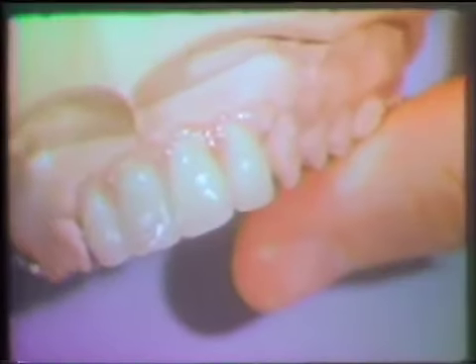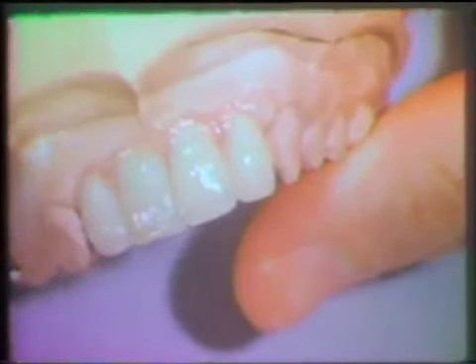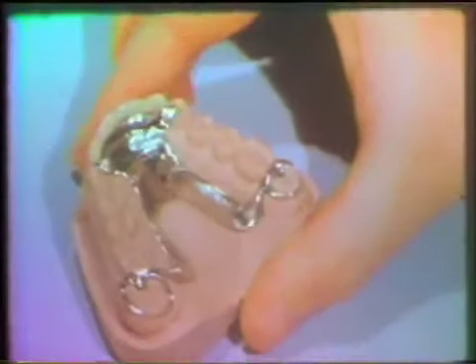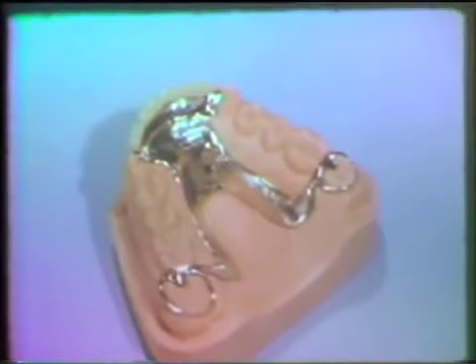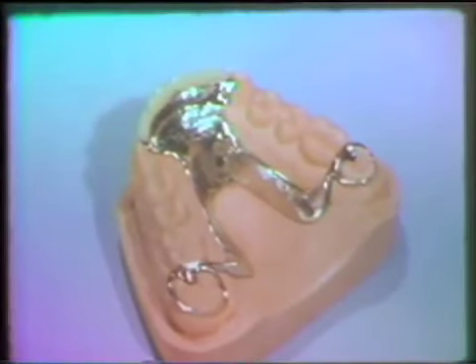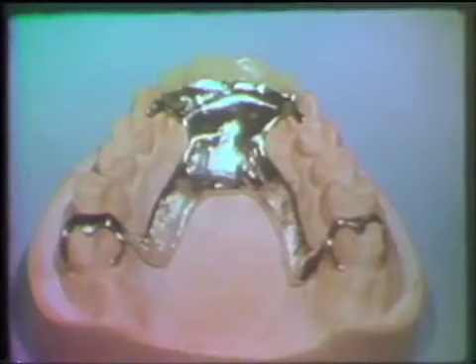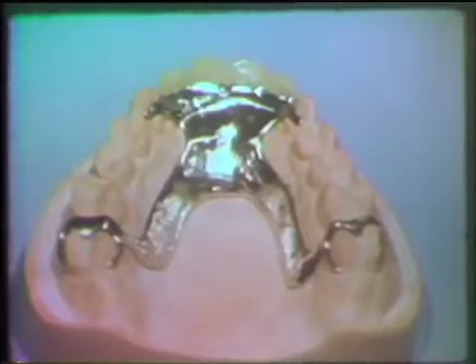The most obvious advantage of the rotational path concept lies in minimizing the use of conventional clasps. The direct retainer requirements are satisfied through the incorporation of a rigid retentive component in conjunction with a specially designed rest. The rigid component rotates into an undercut and is maintained in intimate contact with the tooth surface. The specially designed rest prevents migration of the tooth in function.